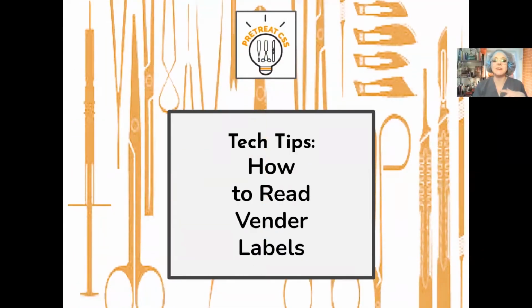Ta-da! This tech tip is all about how to interpret vendor product labels. This refers to, and is not limited to, the labels and packaging that are on the chemicals, disposables, instruments, and even implants that you'll come in contact with during your average regular day in the department.